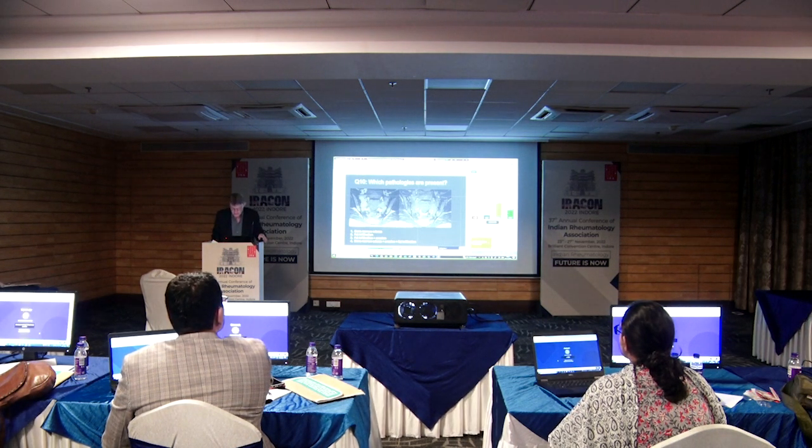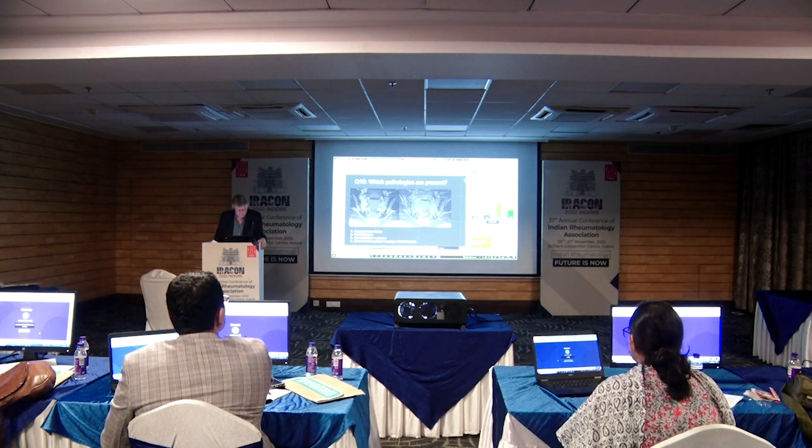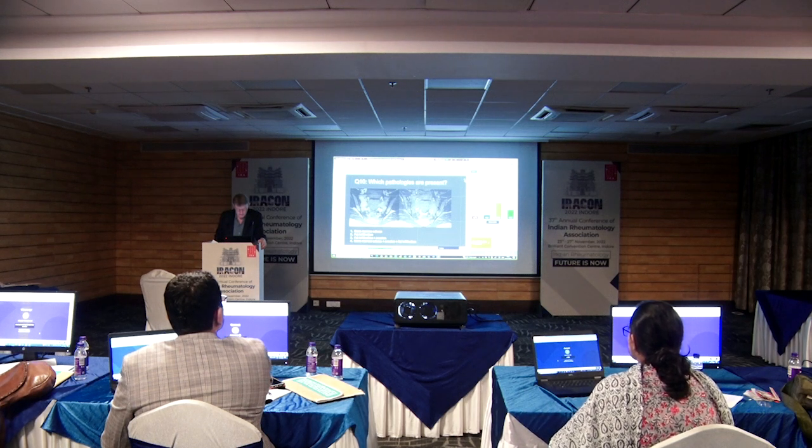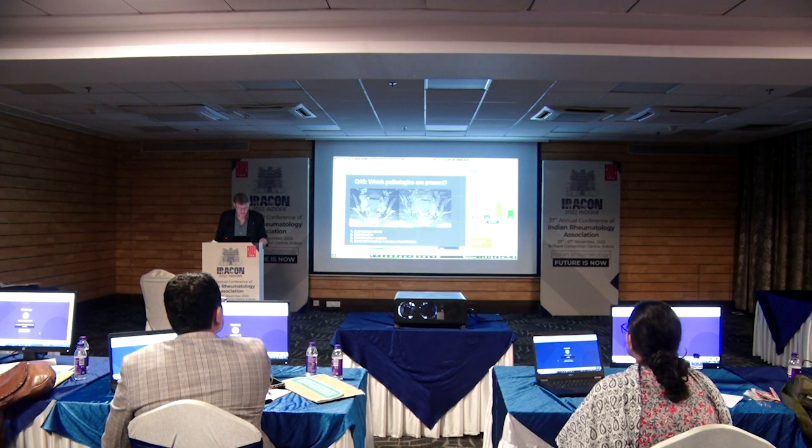Great. And again, you answered well. The majority was correct, and the largest minority, the 11, answered what I would expect you to answer, because it's a little bit of a tricky question. But there is fat infiltration. That's probably the easiest to see, and there are also erosions here, and there's also an erosion actually at this location.